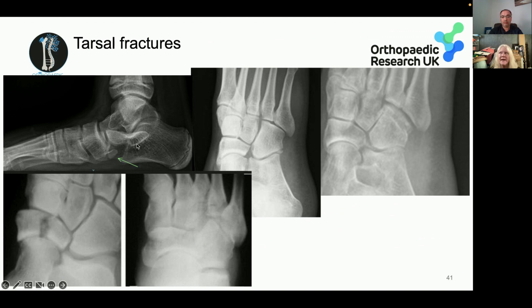Often you see patients with ankle sprains and they have some accessory naviculars or little bits all over the place, and you think it's a fracture, but it isn't always. And the clue here is the smooth rounded edges, and it's in the line of the tib post tendon. So that is an accessory navicular. Let's look at a fractured navicular. Here's one. Here's a nice rectangle bone. Here's the talus, and we've got a fracture through the middle of it there.